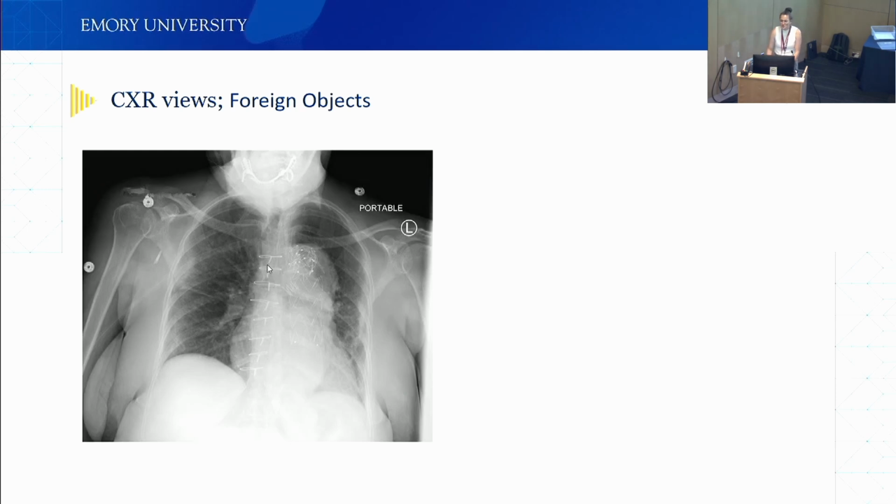Yeah, so these are sternal wires. We see them when patients have open heart surgery. They put a drill through your sternum, it goes open. It's very hard to close, so they put in metal wires to close it again. They don't take them out. They're there the rest of your life. They'll show up on every image, so if you ever see this, you know this patient had cardiac surgery. Anything else that is noticeable?